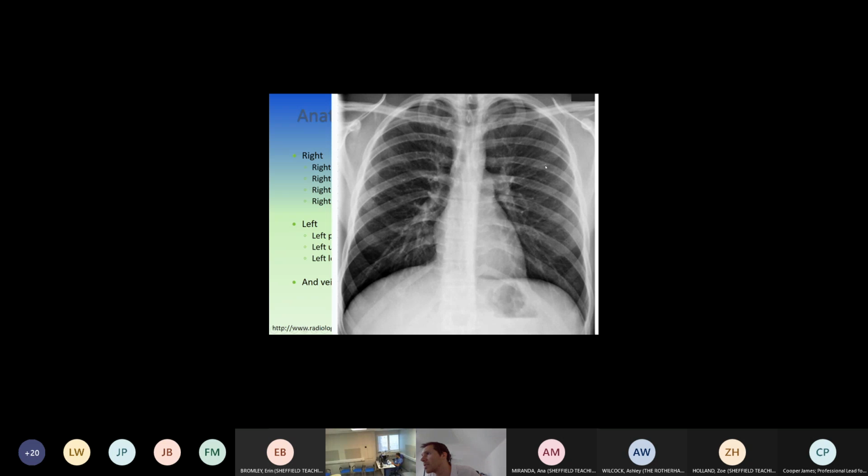Again, I've come to a little white dot there. You can see the blood vessel that it's part of. So the vessel is running parallel to the image, and then it's coming towards you at that point. Again, here you've got a little density, but it follows the blood vessels. The blood vessel is going parallel to the image and then coming towards you and then continuing on. Same here and here. You can see this is a blood vessel going down here. It then gets to that point and branches up and down. Again, here and here. These are all end-on blood vessels.